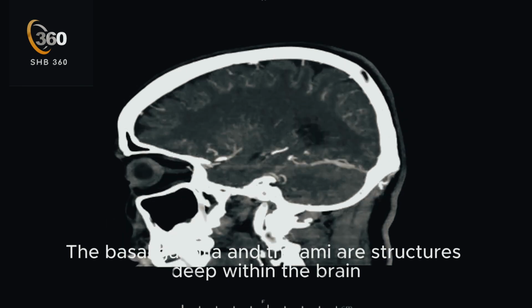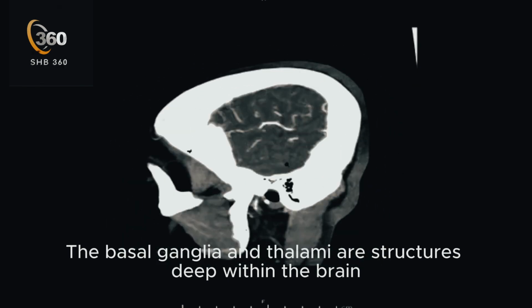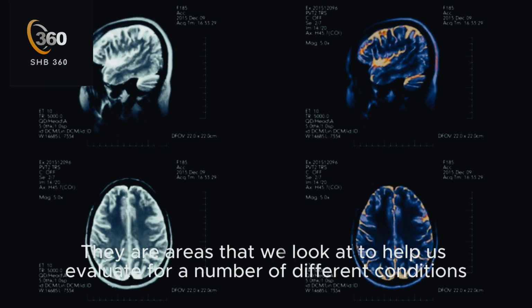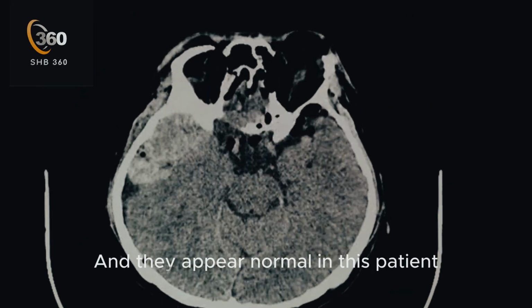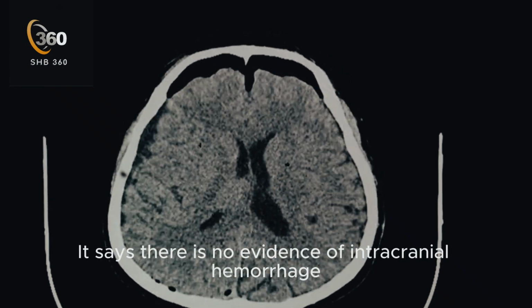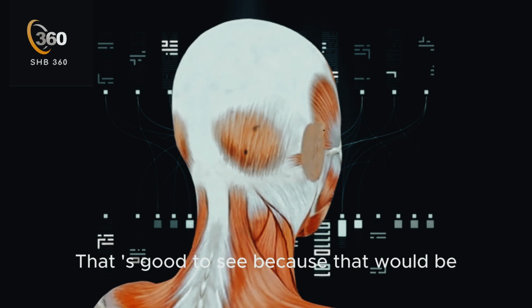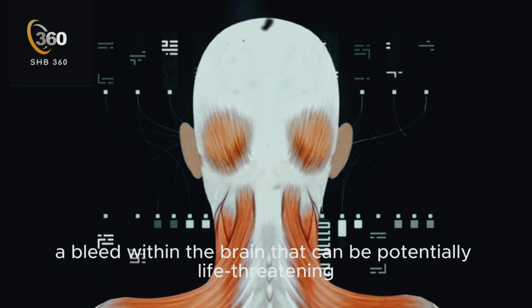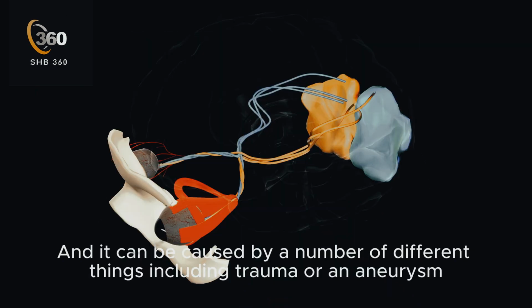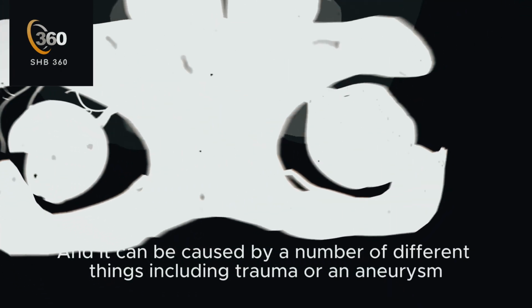It also says that the bilateral basal ganglia and thalami are normal. The basal ganglia and thalami are structures deep within the brain. They are areas that we look at to help us evaluate for a number of different conditions. And they appear normal in this patient. It says there is no evidence of intracranial hemorrhage. That is good to see, because that would be a bleed within the brain that can be potentially life-threatening. And it can be caused by a number of different things, including trauma or an aneurysm.